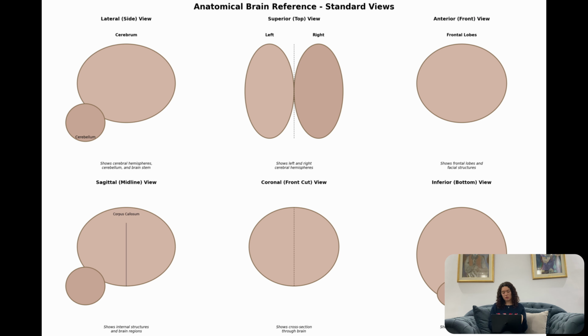So this was a point for me to make an important design decision. Instead of trying to fake a patient-specific 3D, I separated anatomy from inference. This also helps me to remain scientifically honest. The system now uses a reference 3D brain atlas for anatomy. This atlas is a real standard brain template used in neuroscience research, which provides correct brain shape, gyri, sulci, and on top of this reference, I project a tumor volume that is inferred from the model's attention, not directly reconstructed from the MRI.